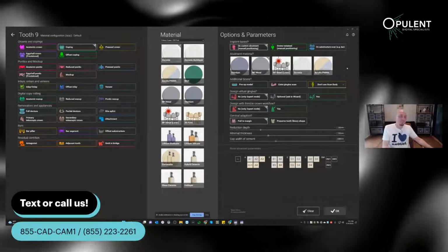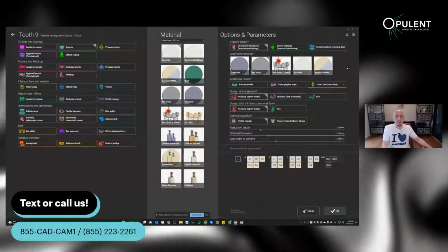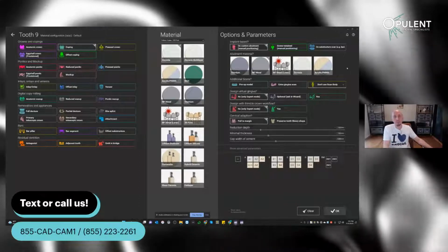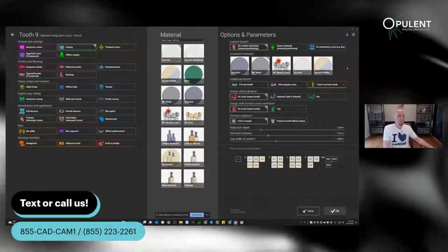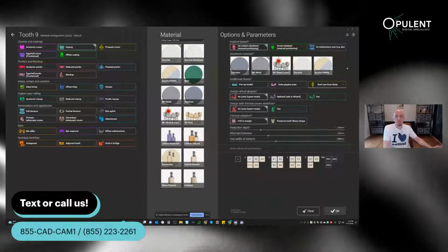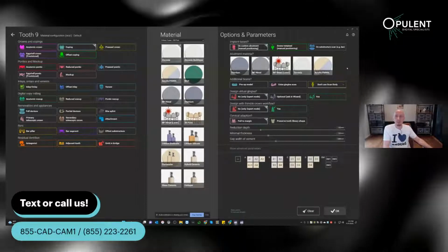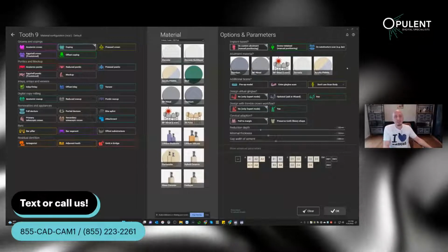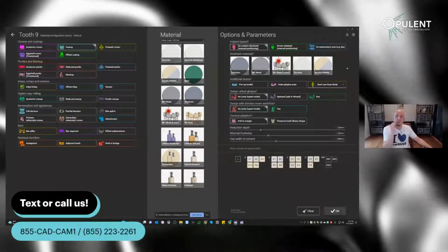And I want to talk a little bit about libraries today, and I thought this option especially is good to demo and show, because there are situations where things get a little iffy, they get a little screwed up. You have a case plan, the case plan has a due date, the case has to leave, and if you haven't been there, you eventually will be at some point.